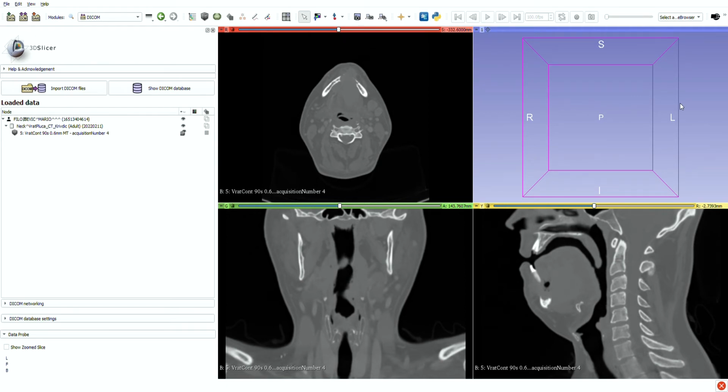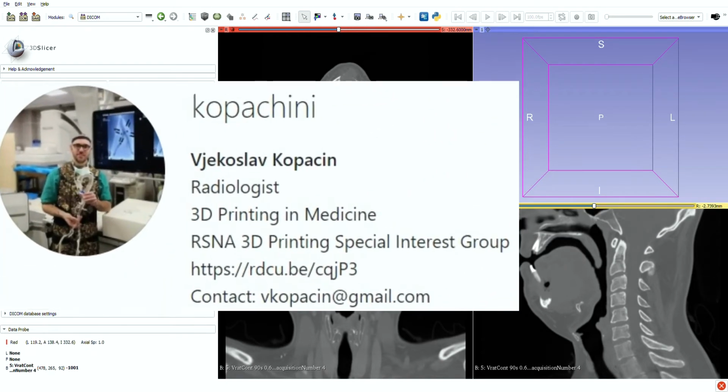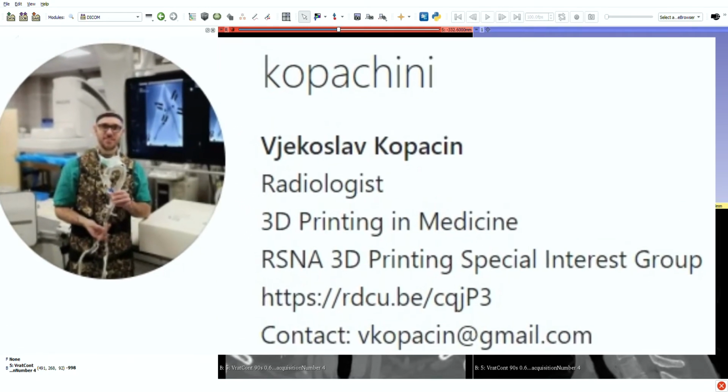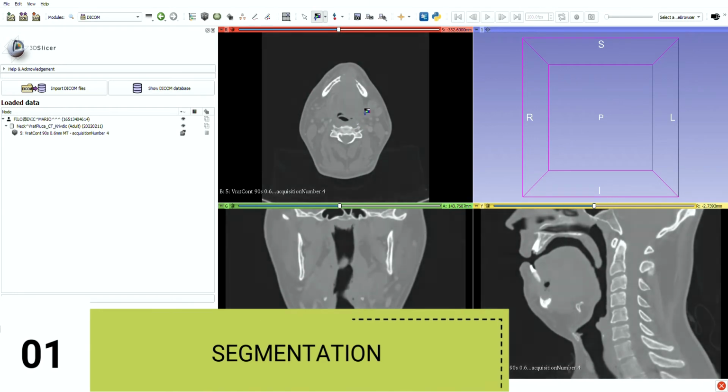Unfortunately, this is a young patient with planocellular carcinoma of the oral cavity that's destroying the mandible. If you have any questions, please feel free to contact me or send a message or write a comment, whatever you want. I'll start with adjusting the window.